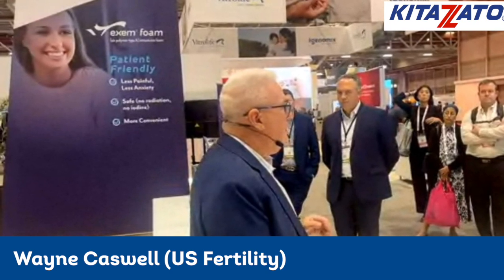Take a second and look. I've had people call me when they thaw eggs and like, the embryos or the oocytes look great and then they die. And I'm like, you missed it. Because if you watch how did it react in TS, how did it appear in DS, you're never surprised if they don't survive in the WS step. So again, be involved, be engaged in the process. Take a look before you move from DS to WS. I expect enlarged perivitelline space.